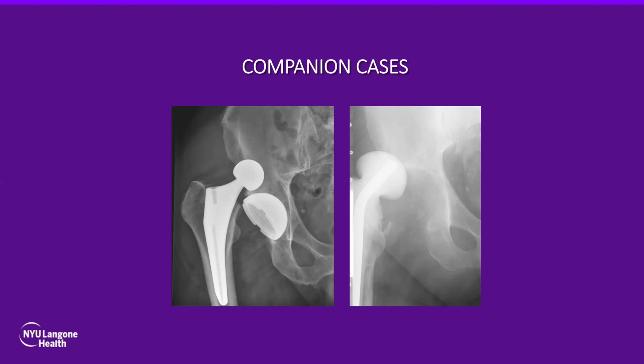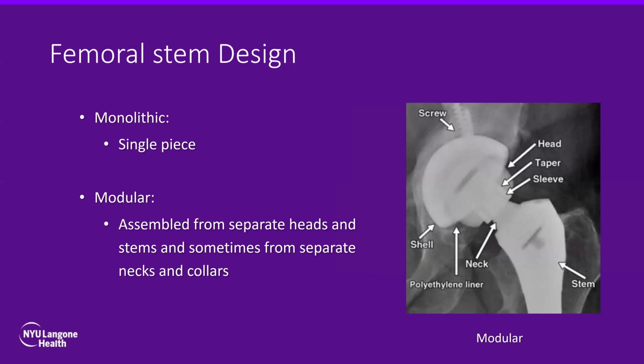The only point that I can tell you about these cases is that sometimes you're not lucky to see the dislocation very well on the frontal view. So just make sure that you look at these radiographs on two views. The frog leg view can be really helpful to show you the dislocations.